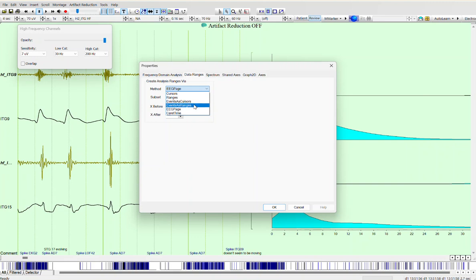And by creating comments with a duration, it saves that in the recording so that you close it, you come back the next day, you want to do the same analysis, you can pick those same marked ranges. But I'm just going to do the current page, not to get into that part of it. I'm just going to say, well, just do it on the visible page.